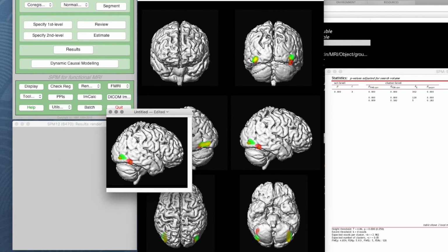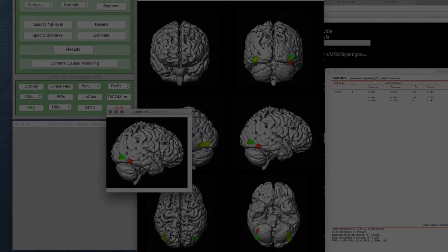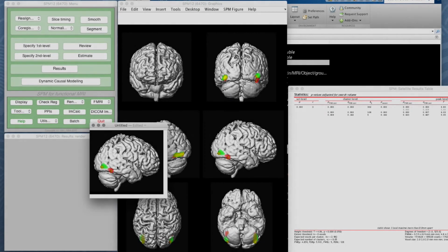One thing you must remember is you can't just paste that into a document and have done. That needs a lot of labeling. It's got to be clear what study it's from. The data represents which participants, one of them, all of them. Which contrasts do these represent? What is the t threshold, or what is the p-value? Is it corrected or not? You've got to explain everything, and it's got to be clear, so someone just glancing at the figure and seeing the legend understands what's going on.